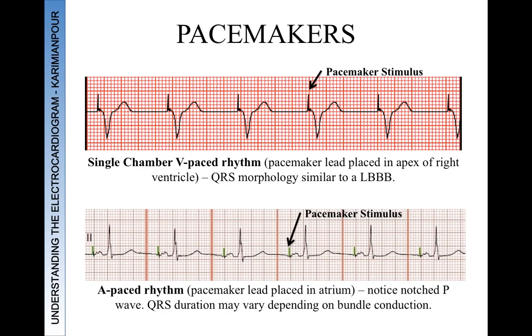So pacemakers, very quickly, there are many different types of devices: single chamber pacemakers, dual chamber pacemakers, CRTDs, cardiac resynchronization therapy devices with a defibrillator or a pacemaker function, which is essentially a 3-chamber device. But these are some simple examples here to make you familiar with pacemaker stimuli.